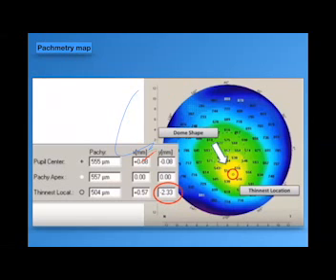I'm talking about the phakic IOL, does it go down the phakic IOL path and its complications, while the error is so small? How many degrees? -2 diopter in one eye and -1.5 diopter in the other eye. This patient is for contact lens or for glasses. I will not advise this patient to do any refractive surgery.